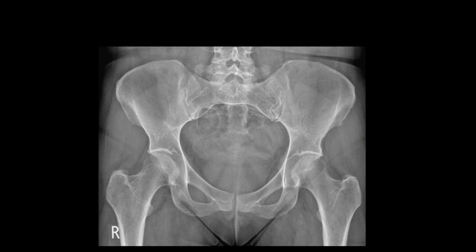Next we want to move on to B. So this is the bony borders to start with, and in the pelvis we have a few different rings. The first one to look at will be the pelvic inlet, and what this should form should be a smooth ring like we have here.